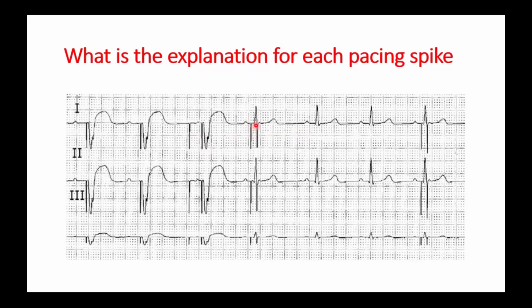The atrial pacing occurs, and incidentally, an intrinsic ventricular sensing occurs. So to prevent this, ventricular safety pacing is done. However, no capture occurs as the ventricle is already depolarized.